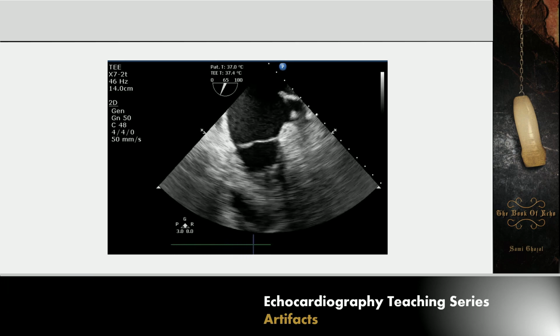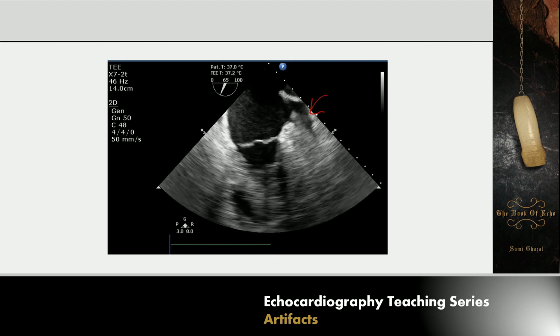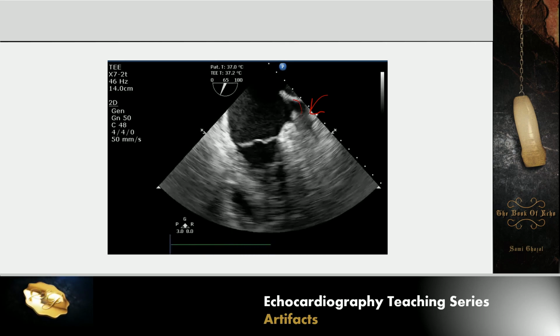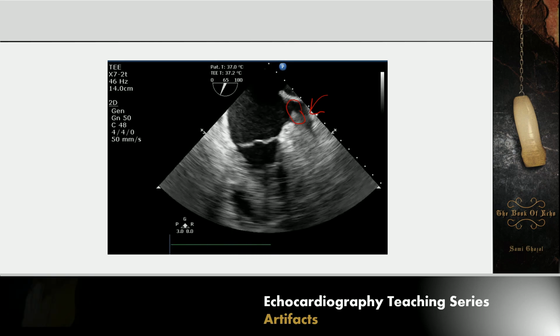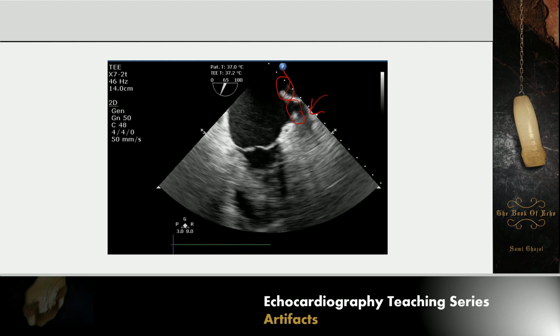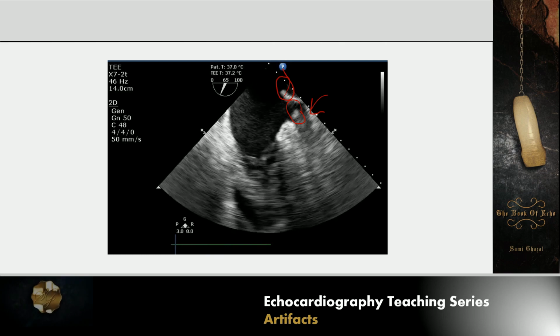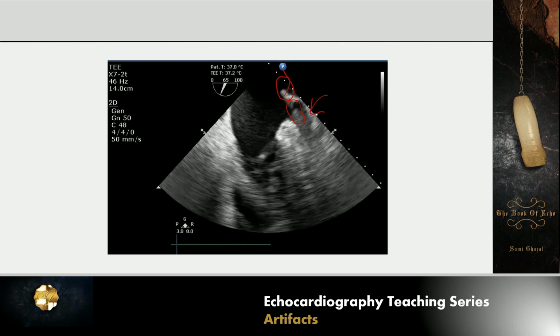If you look at the left atrial appendage, you will see the left atrial appendage moves independently, but this object here follows the Coumadin ridge exactly. So it doesn't move with the contraction of the appendage, but it just follows the Coumadin ridge.